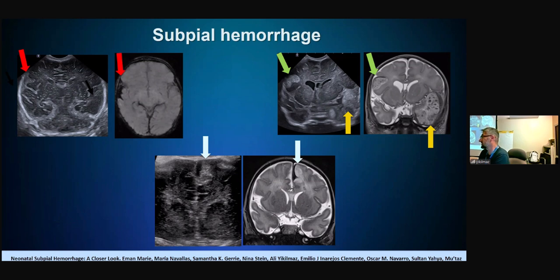So subdural hematoma is like that too. In the subdural space, normally you don't see anything. The dura is attached to bone, and when there's hemorrhage, it becomes visible. So there's subdural hematoma. But this is different. You don't see the subpial space otherwise. But I don't know. Here it looks like subpial to me, associated with some parenchymal changes. Look at this, for example. It's very confined on the brain ultrasound here, attached over the brain surface.